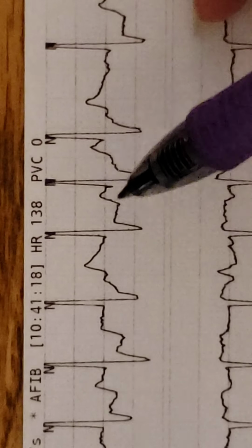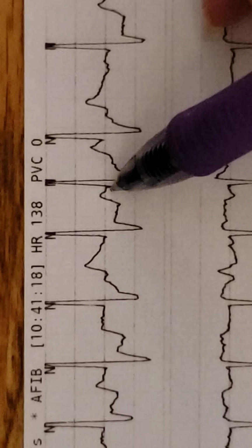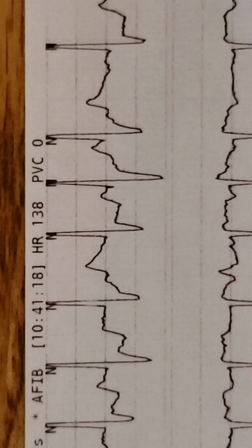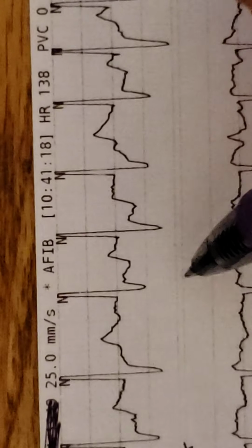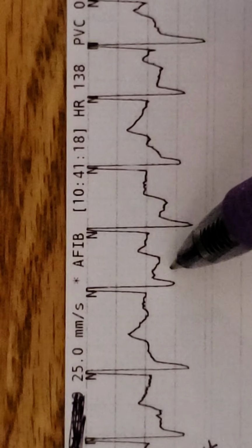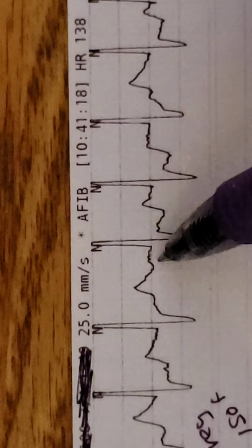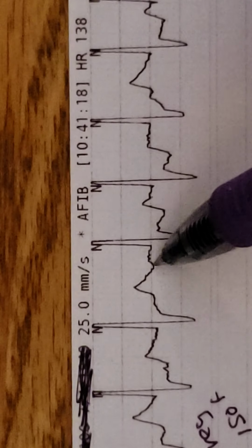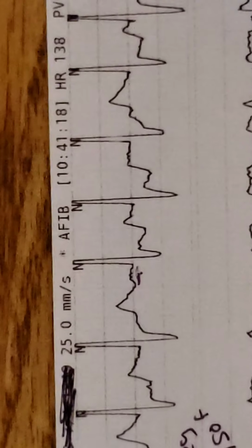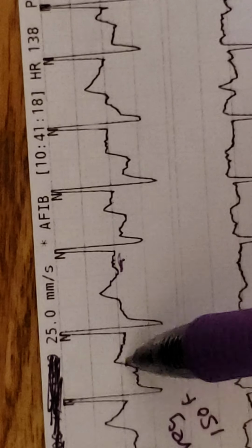All right. So I could maybe think this is a P wave, right? And a QRS, or is that a T wave? I don't really know because it's not clearly defined. If we look over here, I would say maybe this inversion was my T wave and that's a P, or maybe that was a T and there's P, but that looks like 3 of them or something. I can't really tell.